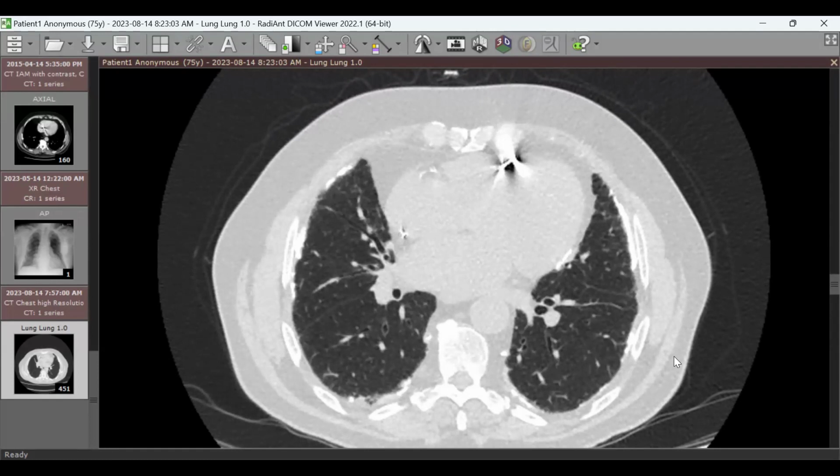So the final diagnosis, connecting these points together, in one word. Just keep it simple. There are asbestos fibers causing damage to the parenchyma. So the disease is interstitial lung disease. We can give it a broad term.